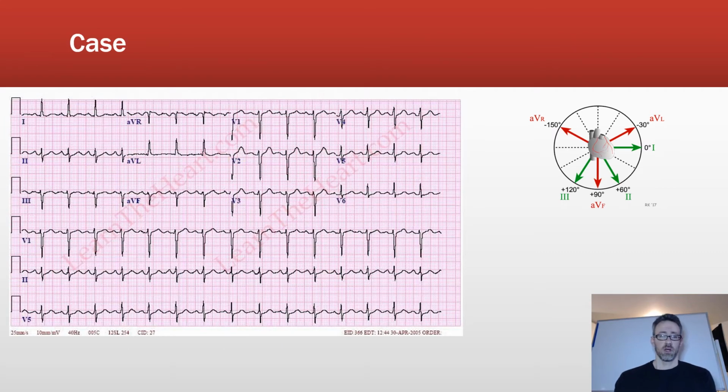Okay, so let's start with some examples now. In this case, we'll start with this very first case here, and I'm just trying to find a good color that I can use here. All right, let's try that one.